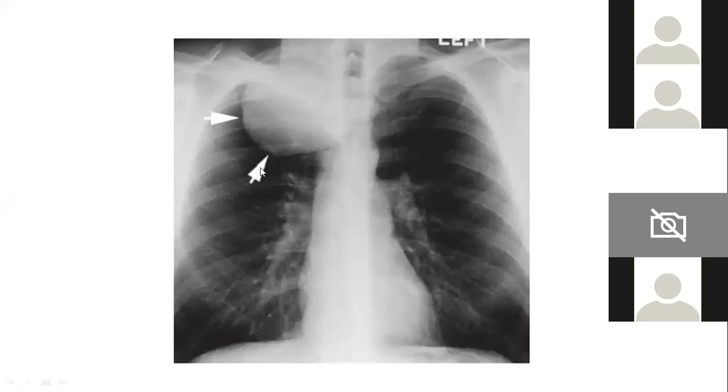Now don't go by the acute angles, they may not always hold good. You may still try to argue that it can be a lung mass because of the acute angles, and I don't think that's wrong, but this is a smooth margin mediastinal mass.